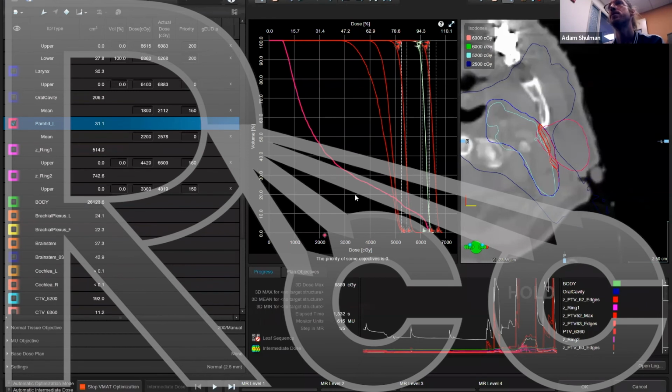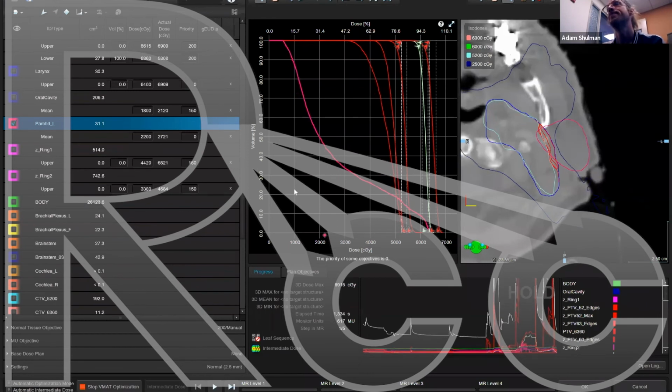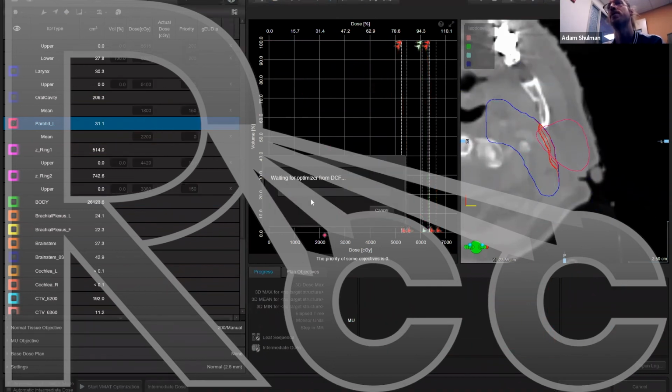Okay, the original optimization. My MLCs are still stuck here. I'm going to start over real quickly.